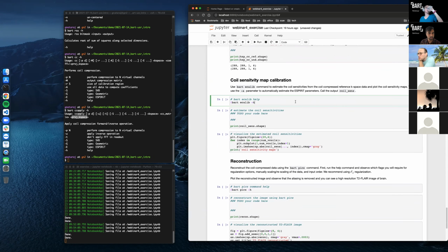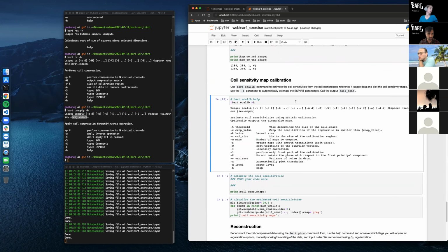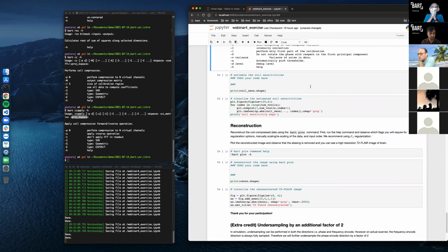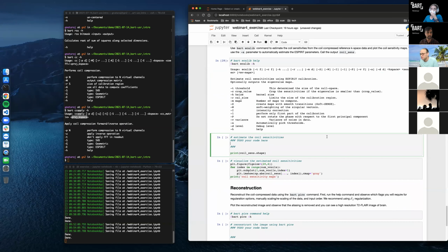Let us continue onwards. Let's take a look at the calibration. Just two more steps, so we're almost there. I see we have, did we have anybody new? We had someone for a second, but then they left. Okay, so let's do the coil sensitivities. That command is eCalib.